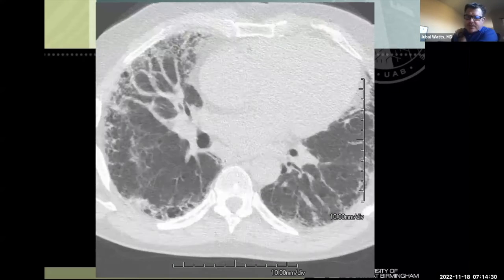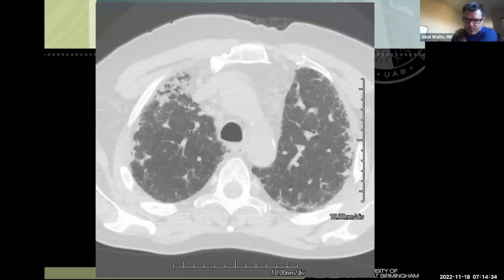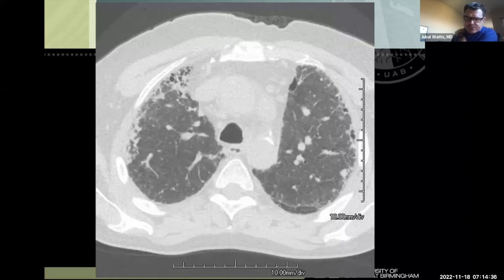One thing is if you don't do a lot of HRCT imaging, we like to do both inspiration and expiration. The biggest role of that is to actually look for air trapping, because hypersensitivity pneumonitis can be a mimic for UIP and IPF. Expiratory images should have the posterior tracheal wall, the membranous portion of the trachea, here should be flat. So when you breathe out, the membranous portion, the area without cartilage, should be flat.